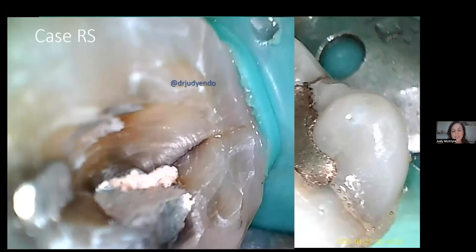In that case, the patient was symptomatic, and sure enough, I went in for endodontics, and what I found was that this crack continued and propagated. One thing I also wanted to address in this picture is the massive amounts of liner under this amalgam. Remember that liner, because I know our favorite course in dental school is dental materials.